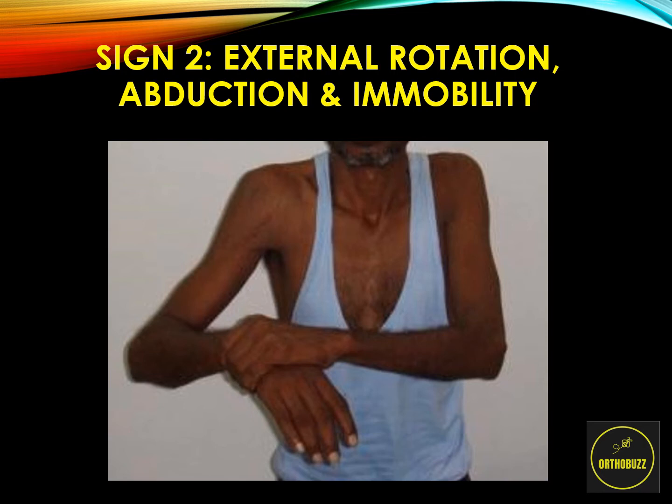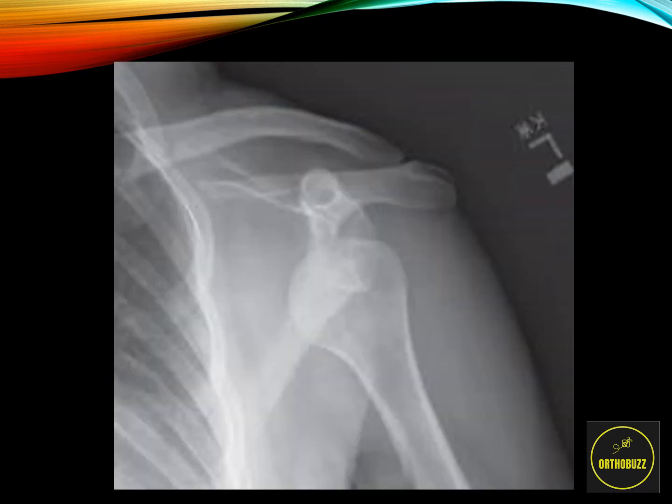External rotation and abduction is associated with an anterior dislocation and may present with a patient such as the one in this picture, holding his arm in that position. So, of course, we're going to get a plain radiograph, and as you can see, this is what's shown in that patient. So let's identify the anatomy. We can see the clavicle, the acromion, the coracoid, and the glenoid fossa.